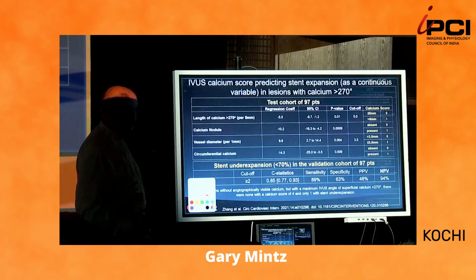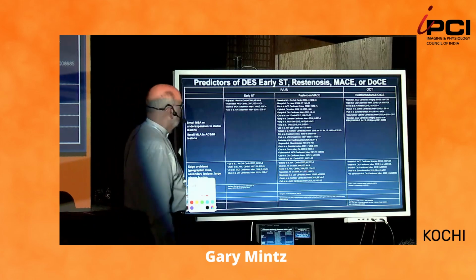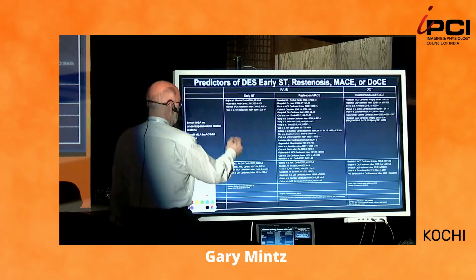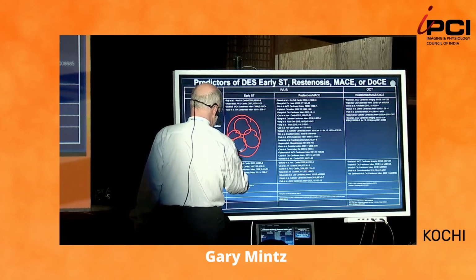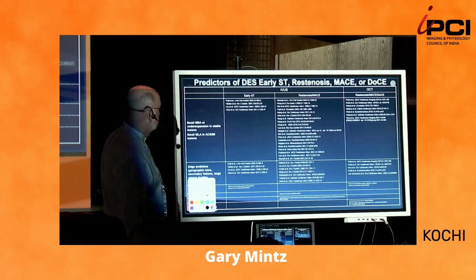Right, well, can talk forever. Web lesions. So I don't have any on here. Web lesions are recanalized thrombi, and if you had a vessel like this, you would have multiple, like Swiss cheese, lotus root, et cetera, et cetera.